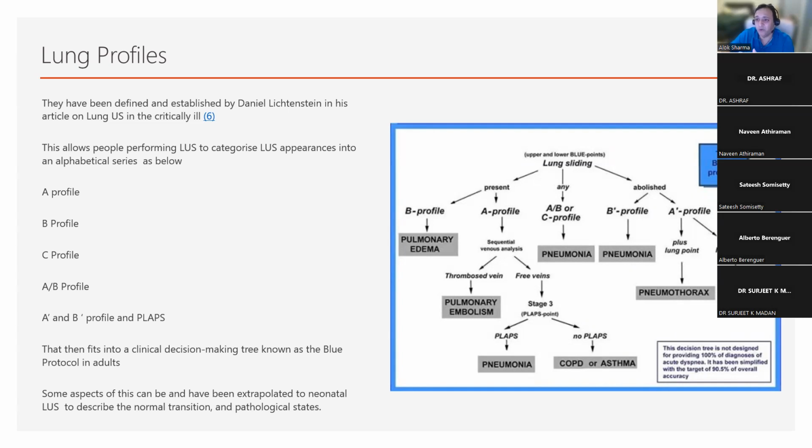You could write that for virtually every intercostal space, and you'll just end up generating a lot of information. When you want to pass that information on, what you really want to give a person is an idea of what is happening in both lungs, which is naturally quite a large sectorial area.